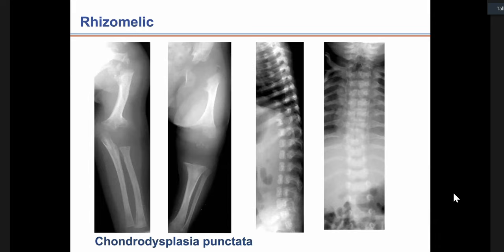And all you may have left might be a scoliosis or abnormal spinal segmentation because of the abnormal fusions of the clefts of the vertebral bodies. Bear in mind that in male infants, coronal clefts, as here, of the lumbar spine may be a normal variant.